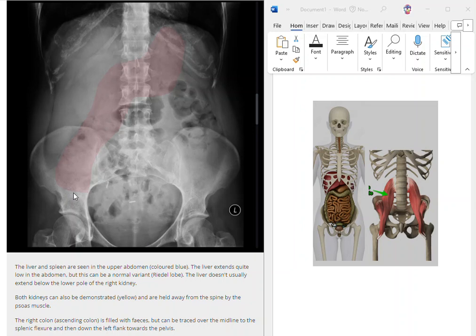There's a potential movement of our transverse colon, so it allows it to move around as we lie on the table and roll around for different x-rays. So yes, it does not look anything like a drawing that you've learned anatomy on. So that's what makes it challenging. That's why anatomy is so important to understand what's on what side. What is more medial? What is more superior? What is more inferior? And what is more lateral?